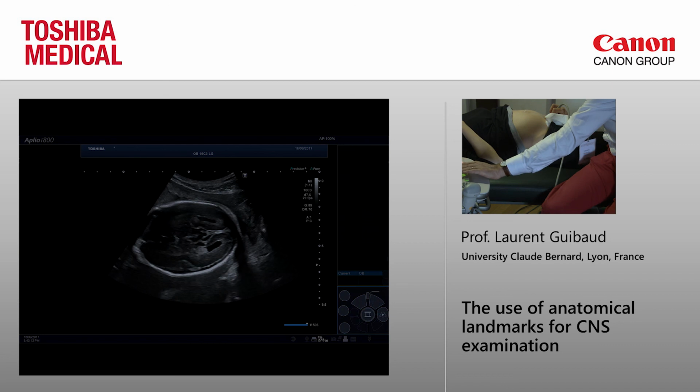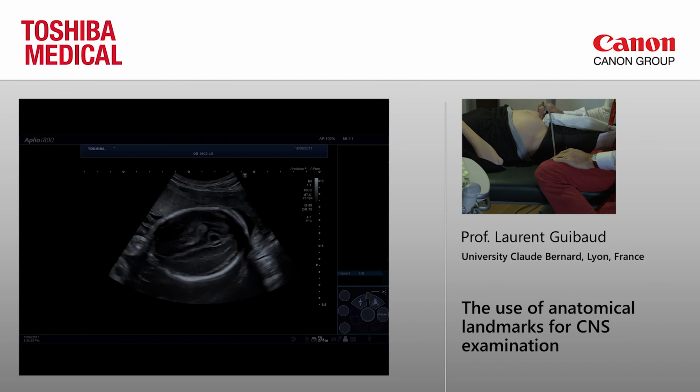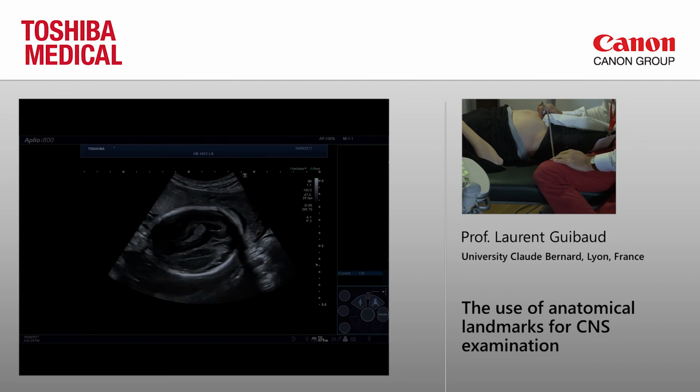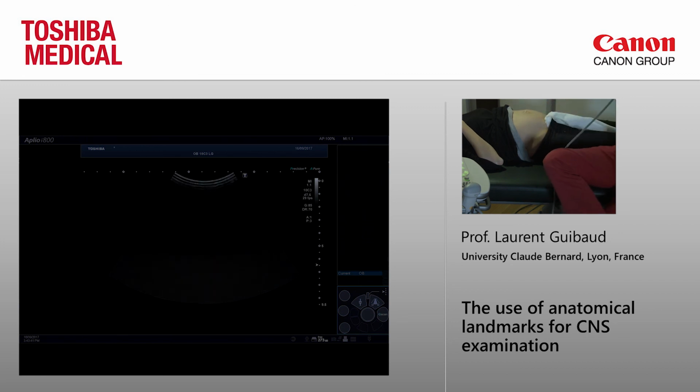So if you know that you are oblique, you know that you will increase the measurements. If you are below 10 millimeters, you can be sure that there is no problem. The fact is, when you are dealing with a possible ventriculomegaly in the proximal hemisphere, you may do that to have a look and to be sure. But when you do that, you do an axial and oblique view. So in that case, you are not orthogonal, but in fact oblique.